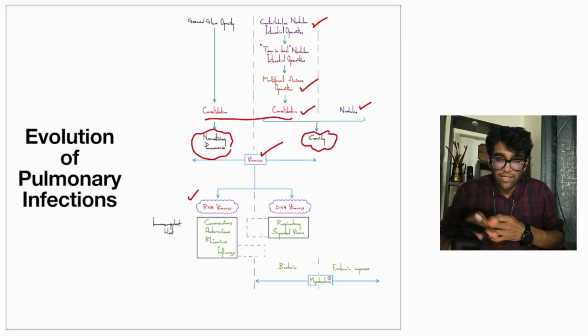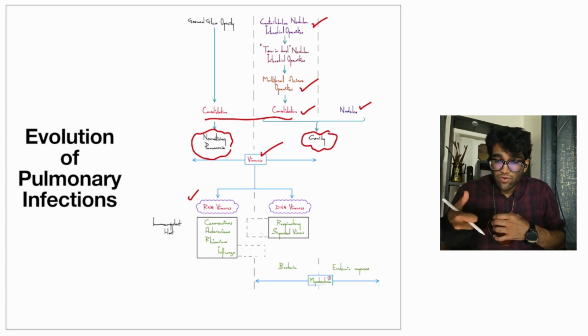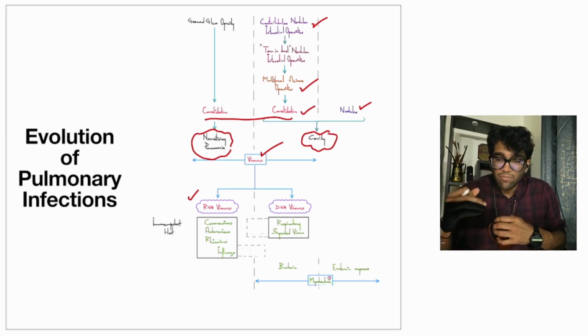So influenza is more likely to cause a ground glass opacity becoming a consolidation, and RSV is more likely to go through those four stages and then produce consolidation. What is important is that tree in bud is specific for infection, but if you see multiple of these opacities, so you see ground glassing and you see consolidation, that slightly increases the probability that it's an infection. Similarly, if you see tree in bud opacities and then you see a consolidation in the same CT, it indicates that the patient has an infection.